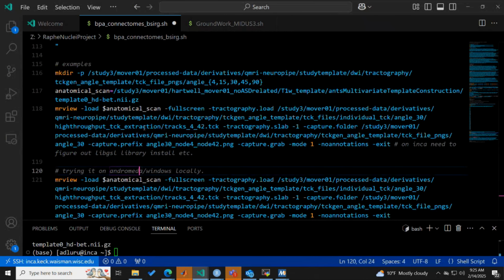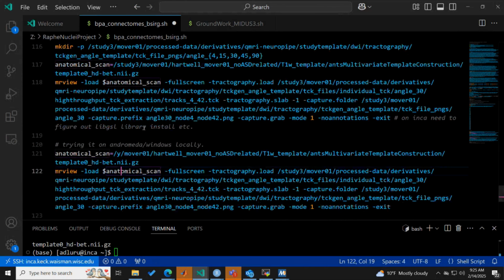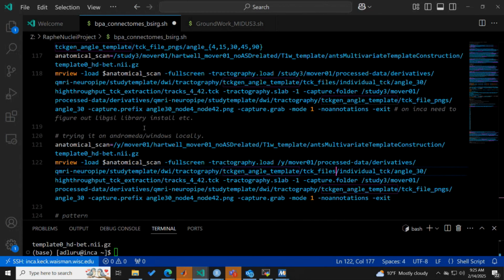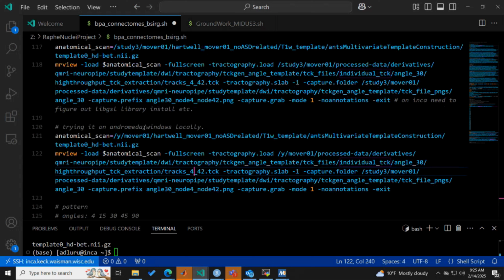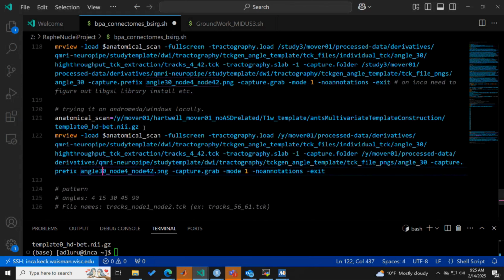Pause me if anything I'm saying or doing doesn't make sense. Yeah, I think it should make sense. It does, yeah. Okay, good. Y. And so that's a tract. This is the output folder. I'll add one more thing to this. This is all in the template, right? Yeah.